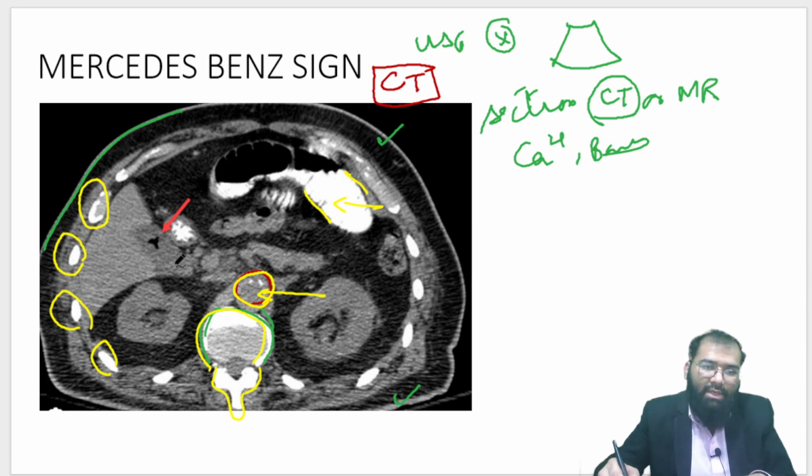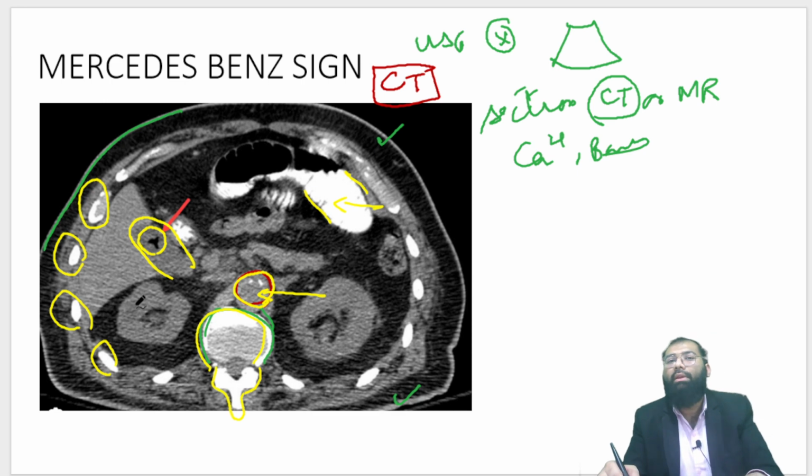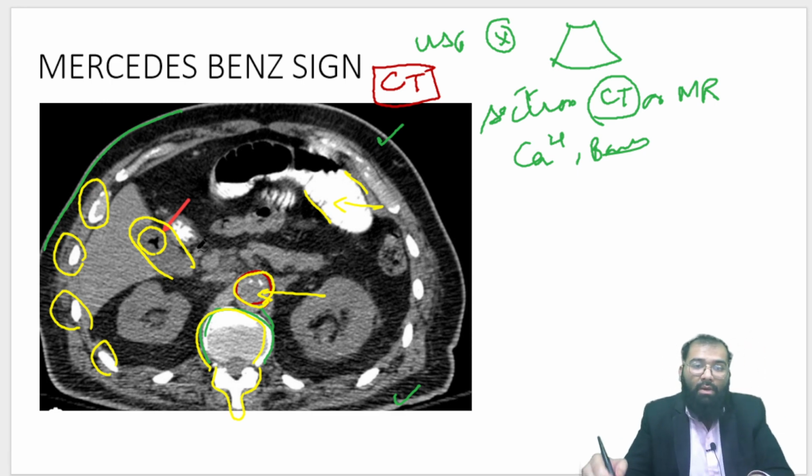And now we see what we are supposed to see here. You are able to see here, this is GB, this is the region of gallbladder, and this is a gallstone which is lucent here, probably it is not seen. So lucent stones cannot be seen even on CT. But what you are able to see is air. Very important. Again, you know how does air look on X-ray?